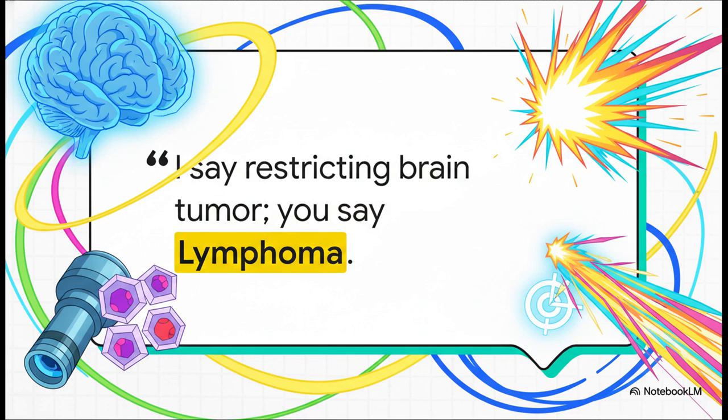If you see an enhancing brain tumor in an adult, and it's also incredibly bright on diffusion imaging, meaning it's restricting, the first name that should leap into your mind is lymphoma. It's just such a powerful association, it gets you 90% of the way there.